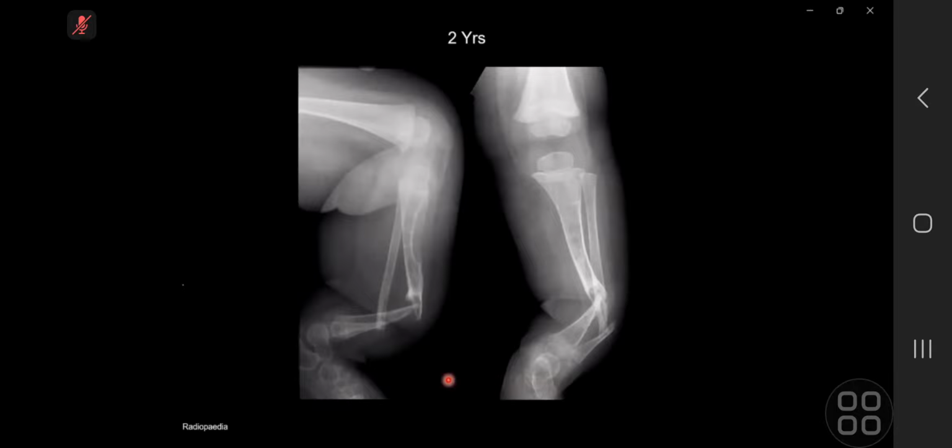I would want to look at other x-rays of the patient to look for other fractures to help me confirm the diagnosis. I'd also want to ask the clinical team for more information. For example, do they have a hearing aid or any deafness? Other things I would want to consider would be neurofibromatosis, or I should also consider NAI and malformed healed fractures.